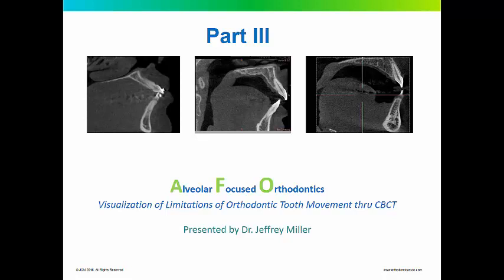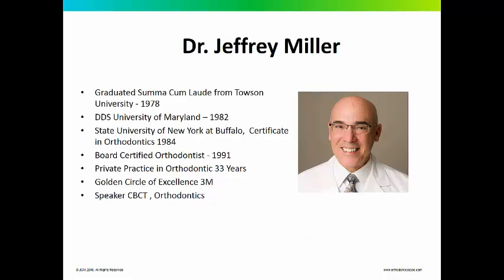This is part 3 of a 5-part series on alveolar focused orthodontics, visualization of limitations of orthodontic tooth movement through cone beam CT. I'm Jeffrey Miller.